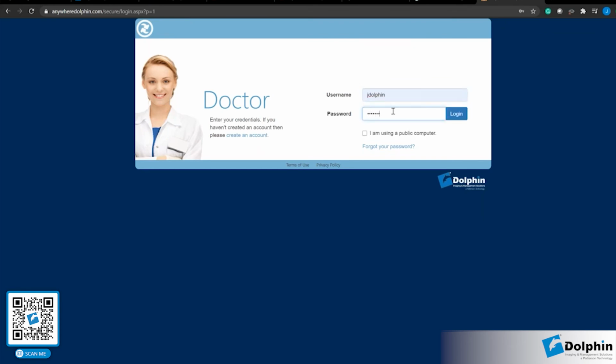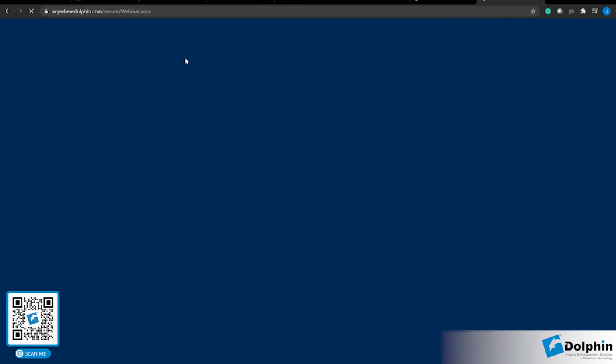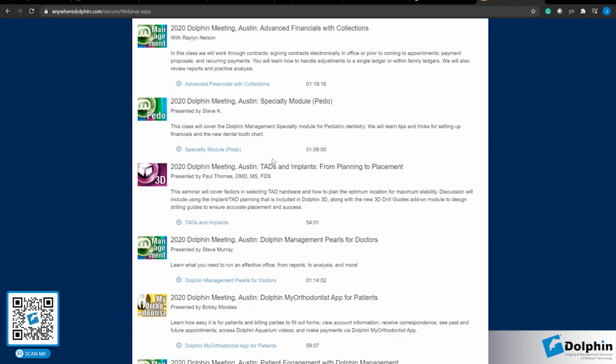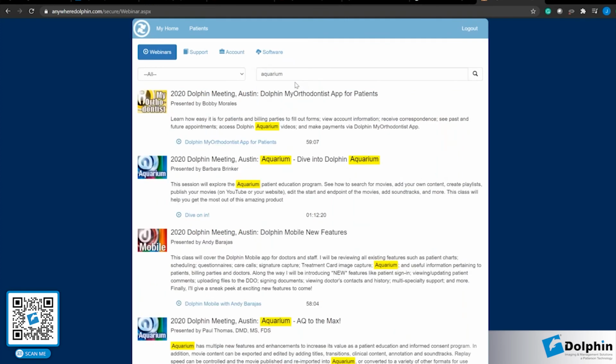If you have not set up or accessed Anywhere Dolphin before, Dolphin support is more than happy to assist you in getting that up and running. And from here, you'll simply click on Dolphin Service Club, and you'll have access to all our training video content that goes into great detail of the software. You can even do a search, like if we do aquarium. We just had our Dolphin user meeting in March, and we recorded a lot of our presentations, and those videos are available now on our website.